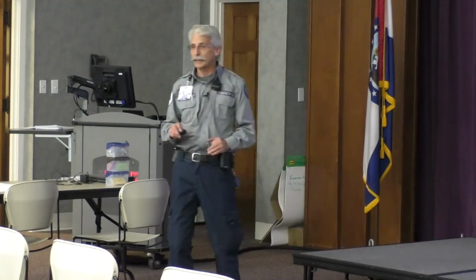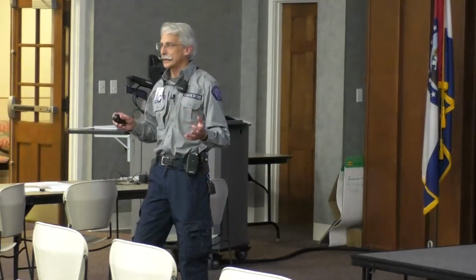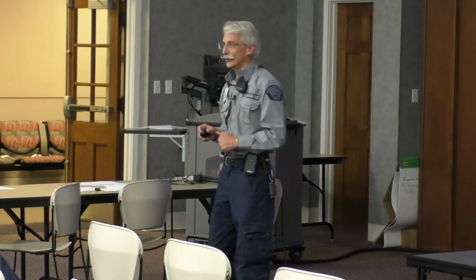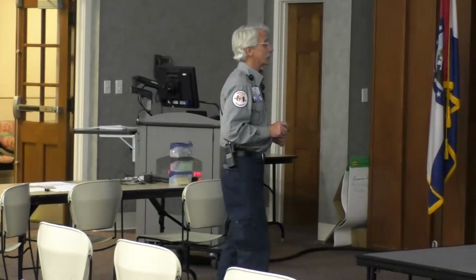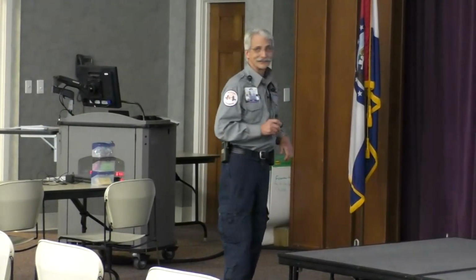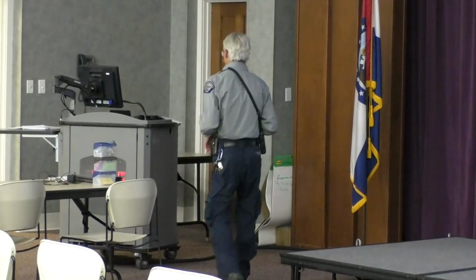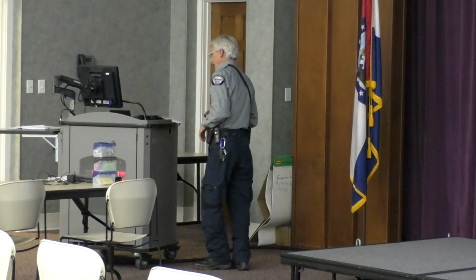So what I'm going to do, we're going to skip a bunch of them, and I don't have them all blanked out, so we're going to have to go through a couple till I get to the next one. All right? But we will look at the first one. Not good, right? I think so. All right.